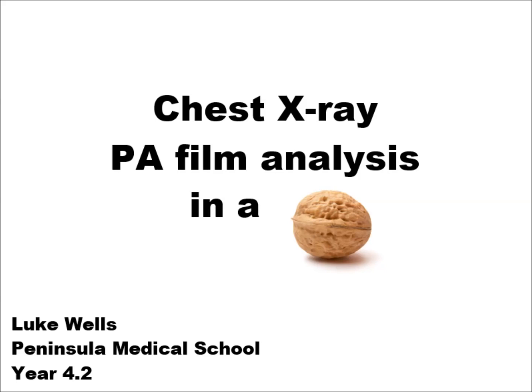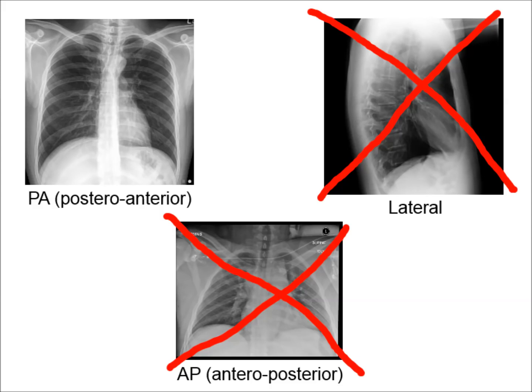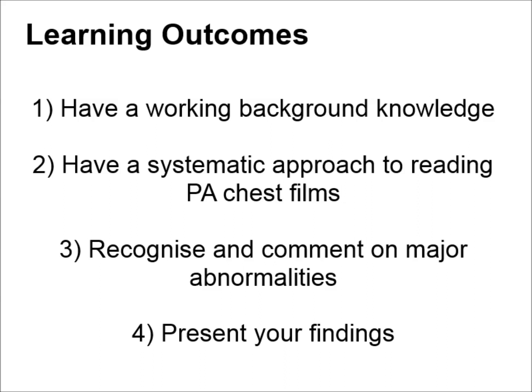Reading a chest x-ray is a vital skill for medical students and doctors, and often comes up in exams. While there are other chest film views, PA is the most useful and by far the most common view you will encounter, so this is what I'll be teaching in this short video. As this video is teaching the skill of reading a chest x-ray, I will not cover the more advanced skill of how to diagnose particular chest pathologies.